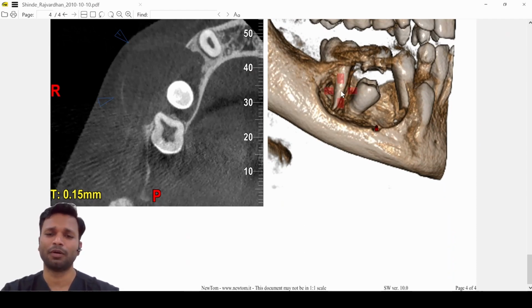On the mesial root of the permanent molar, there is bone resorption. The distal root is inside the bone. We have the impacted premolar, we have the erupted premolar, and we have the deciduous tooth, the deciduous molar.